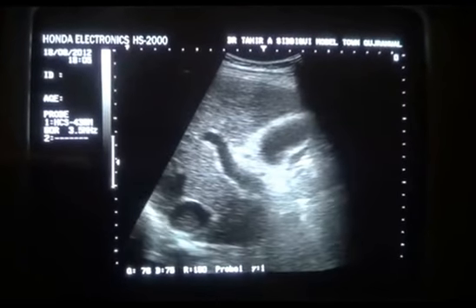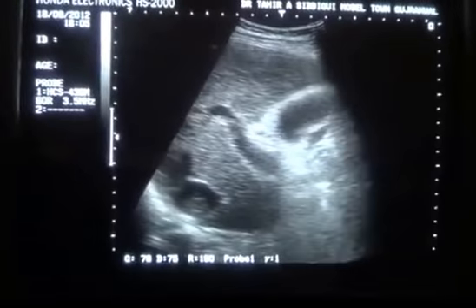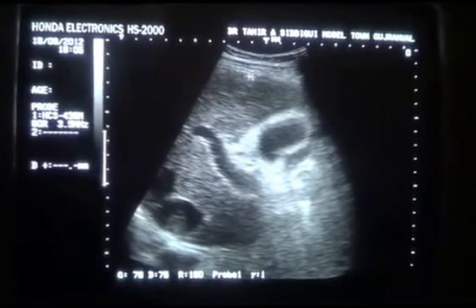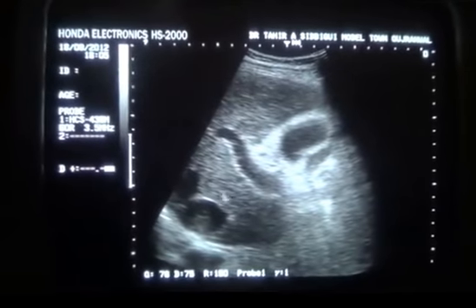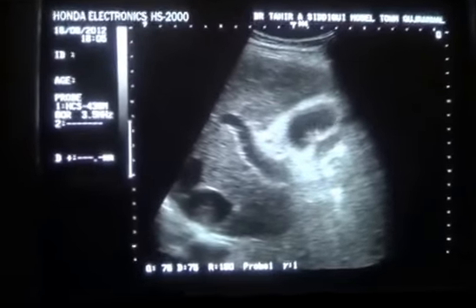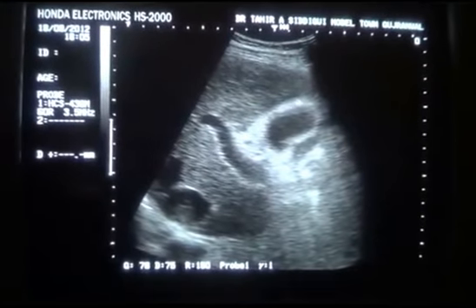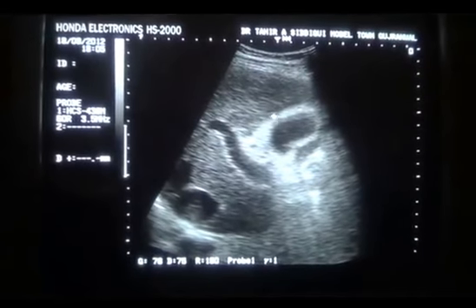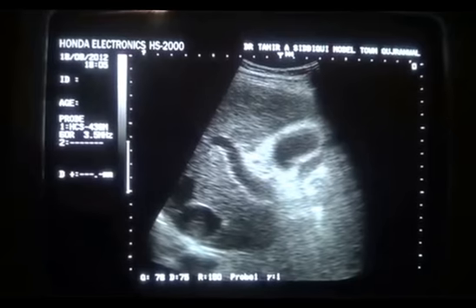Well, here I am showing you an image of a cirrhotic liver in which this is the outer surface, this is the raised echogenicity of the liver, and the coarse texture is also in front of you. This is the portal vein, this is the gallbladder, and the walls of the gallbladder always appear thick in cirrhotic liver in most cases. The thickness of the wall that you are seeing is because of the adjacent cirrhotic liver.